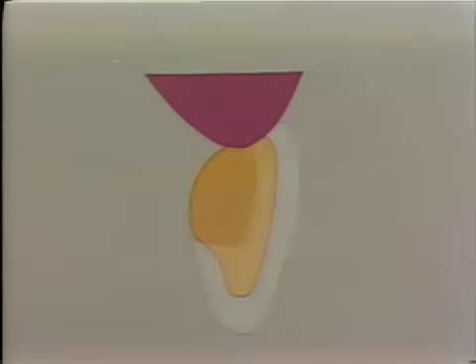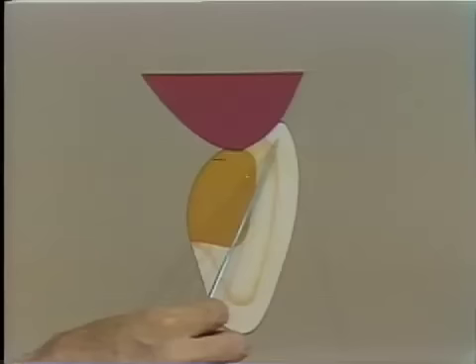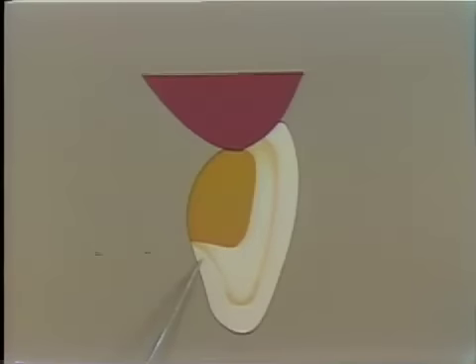porcelain situation in relation to the gold, you can see from this diagram where the porcelain area is just fading in and out, the relationship of that porcelain to the gold core. There has to be a 1 to 2 millimeter thickness of porcelain around this area of the gold on the labial and on the incisal and onto the lingual surface.